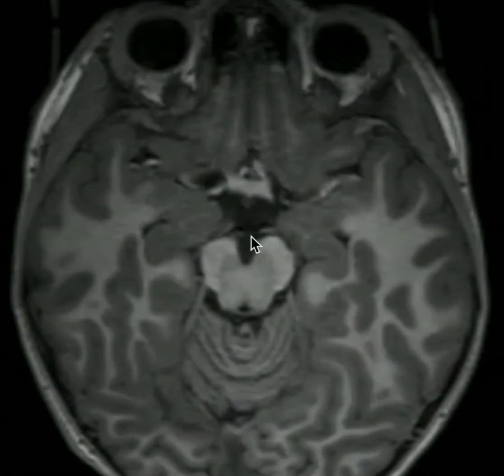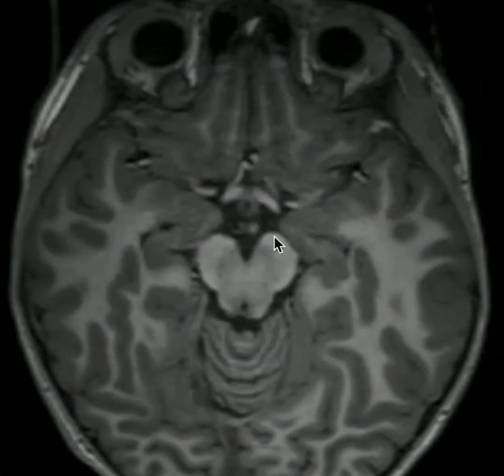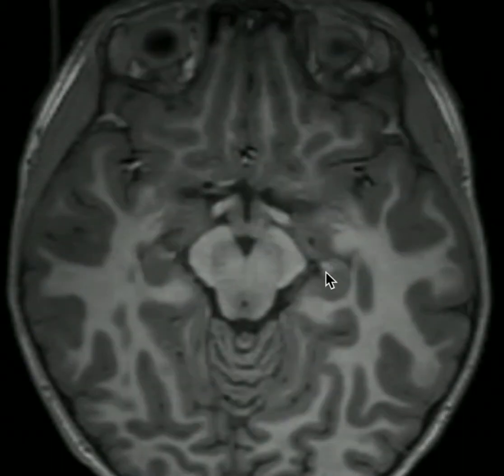So if I go back up to the level of my hippocampus and draw a line out horizontally here, everything posterior to this line but anterior to a line here drawn along the interpeduncular fossa will represent the head of the hippocampus. More posteriorly and adjacent to the brainstem, back here we have the body of the hippocampus. Because the hippocampal formation goes superiorly and posteriorly, I'm going to scroll superiorly a couple slices here to get a better view of the rest of the body along here, adjacent to the brainstem.